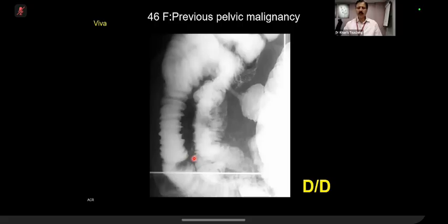My question is regarding the concepts. This case is a post-radiation case. How do you explain all of these findings in post-radiation? It's fibrosis as a result of radiation. Okay, so let me tell you, if you remember this concept, you can make your radiology diagnosis. It's basically vasculopathy. Small vessels are affected by radiation, and it is an ongoing process. So it's an acute over chronic process.